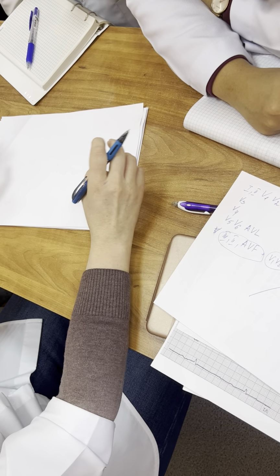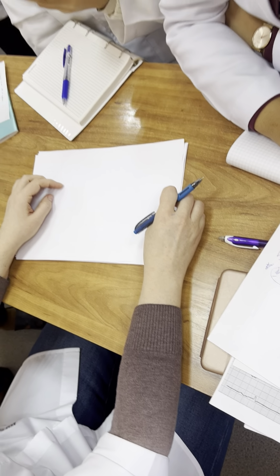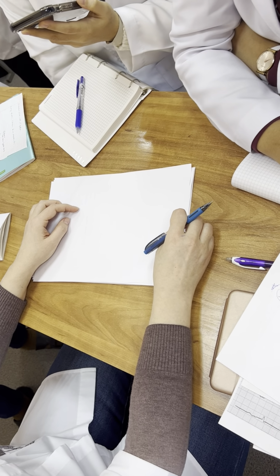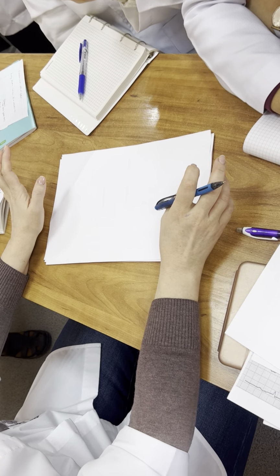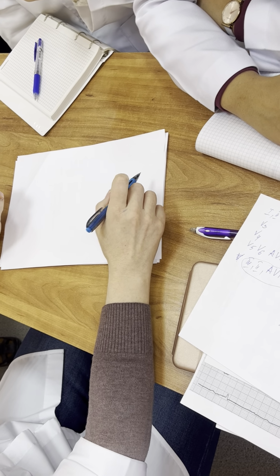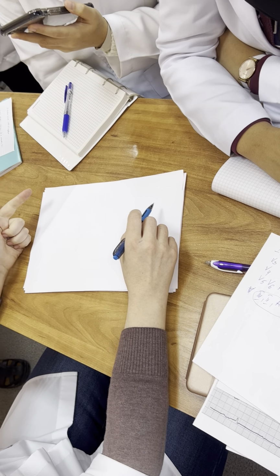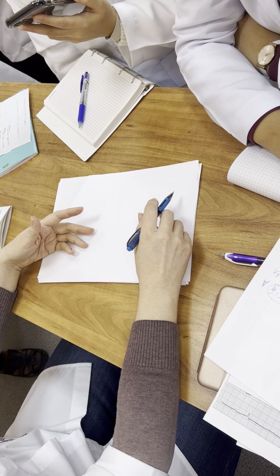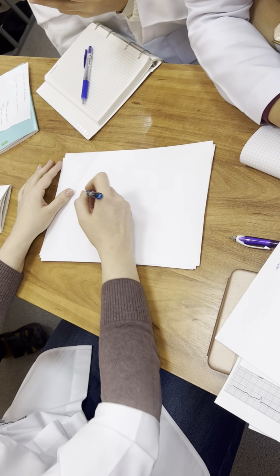Last moment, non-QMI. I told you these are not specific changes, non-specific. The same may be in arterial hypertension, in myocarditis, in valve problems, dyselectrolyte disorders, a million other diseases can give the same changes in ECG. So, if we talk about non-QMI, first of all, clinical picture, next, markers of necrosis, and only the last variant is ECG. Understood? Only by ECG you can't differentiate non-QMI.